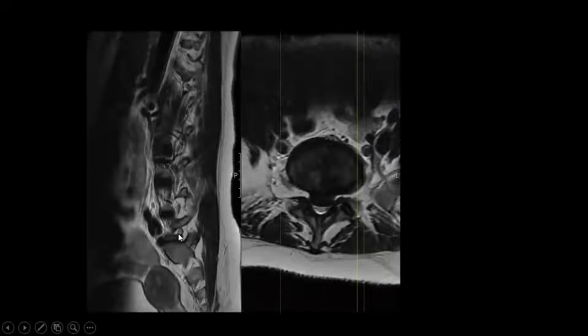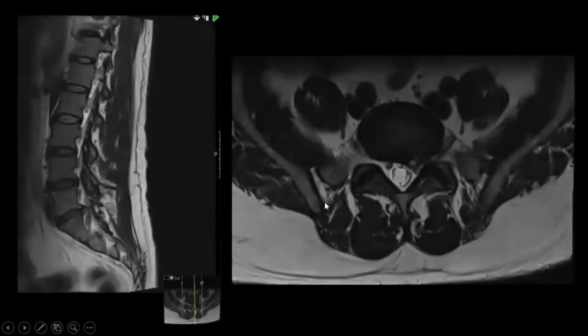So going on to the sagittal scans, you can see that this disc is abutting the lower end of the nerve, which is therefore probably splayed, but you wouldn't call it obvious compression because its morphology is generally circular and maintained.